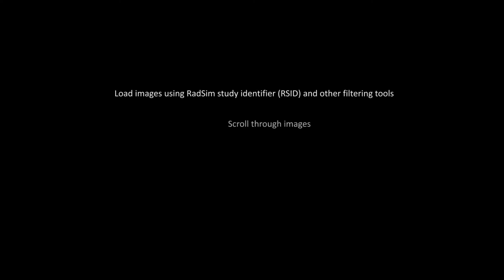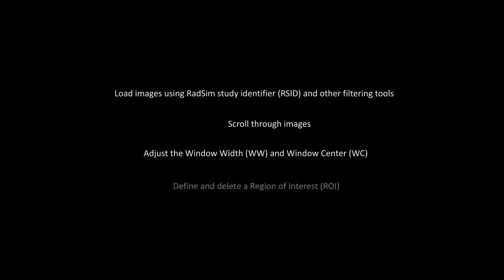In this video, we will go over how to load images using RadSim Study Identifier or RSID and other filtering tools, how to scroll through the images, how to adjust the window width and the window center, and how to define and delete a region of interest or a ROI.